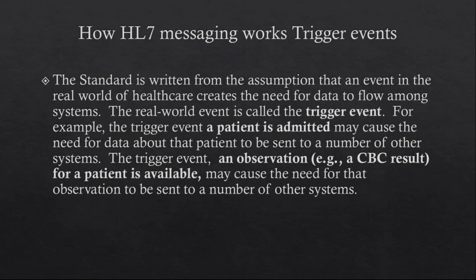So let's look at how HL7 messaging works. It basically works on trigger events. So we'll see what trigger events are. Before that, we'll try to understand what events and trigger events are. So now we'll refer back to the hospital workflow again.